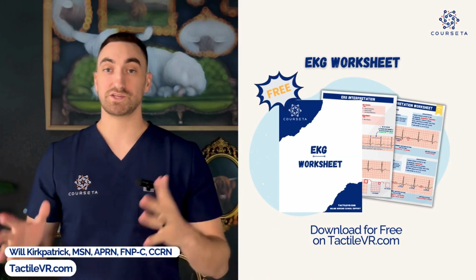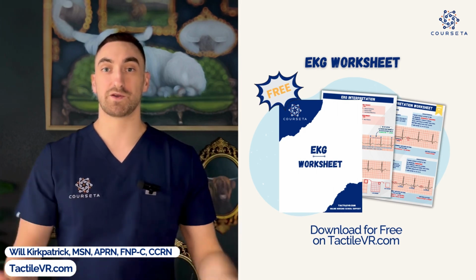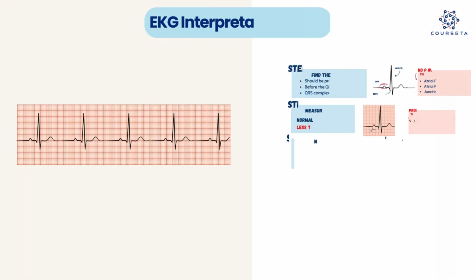All right, guys, you already understand the basis of an EKG, so let's get right into how we interpret the EKG rhythms. We're going to go over all of the EKG rhythms that they could be testing you about in nursing school, and I'm going to show you how you can easily identify them in less than 5 seconds if you're really good at it. But if you haven't already, make sure you download our free EKG study guide, as you can write notes along with this video and it'll help you better retain the information we're going over. All right, let's get right into it.